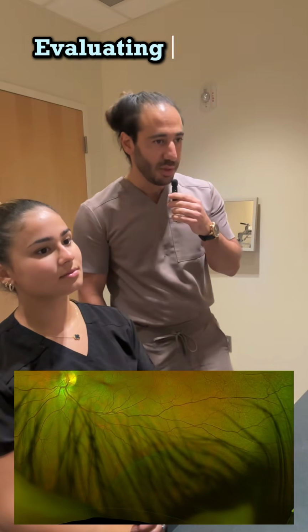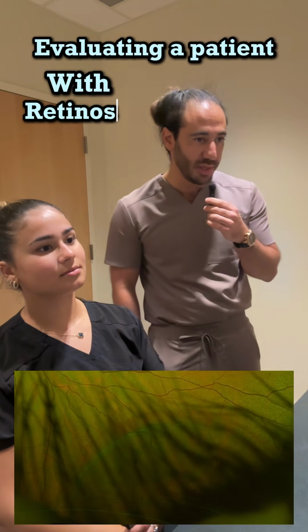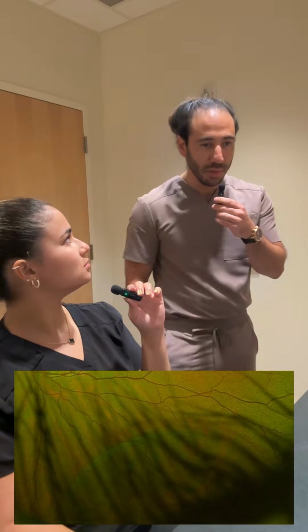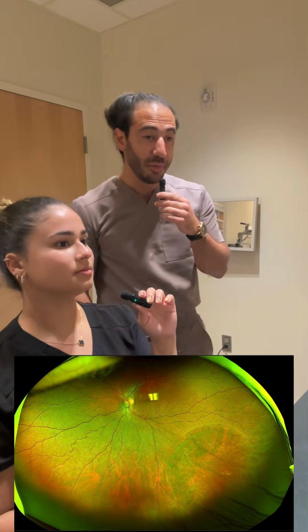What do you see on the fundus of this 46-year-old male who presented for new glasses? It's hiding behind the lashes, right? Looks a little bit elevated. We took another picture. Click on the other picture. Now we have a very clear picture of it.